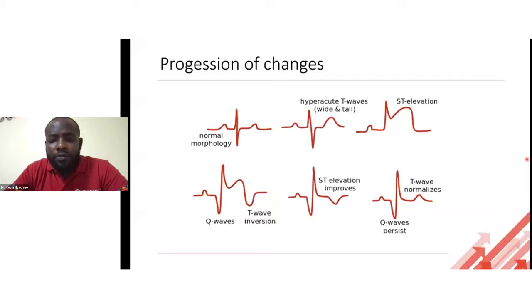In all other leads, an ST elevation of greater than 1 millimeter, I think, and with the absence of ventricular hypertrophy or a strain of the heart, that is the left bundle branch block, is significant as well.